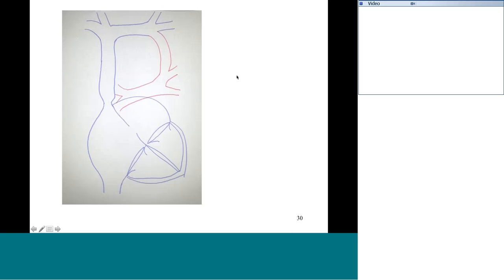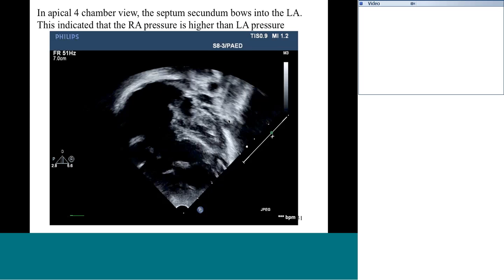It's important to note what are all the common sites of obstruction, because on echocardiogram you have to use a checklist and identify: is the common chamber hypoplastic? Is the pulmonary vein hypoplastic? Is the left vertical vein obstructed by a hemodynamic vice? Is the left vertical vein obstructed at the level of the vertical vein to innominate vein junction? Is the right superior vena cava obstructed at the superior vena cava atrial junction? Is the PFO restricted? So these are the 6 areas where the left vertical vein TAPVC can get obstructed. So it's like a checklist. You go and identify what is happening here.